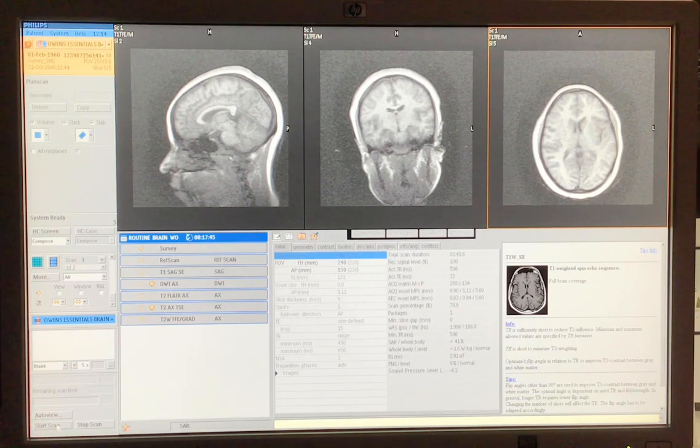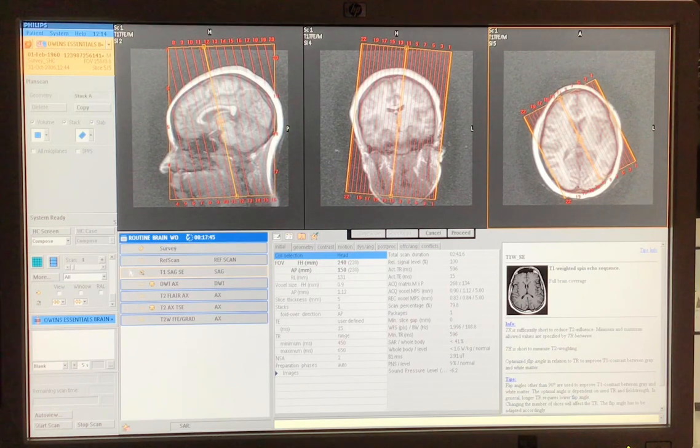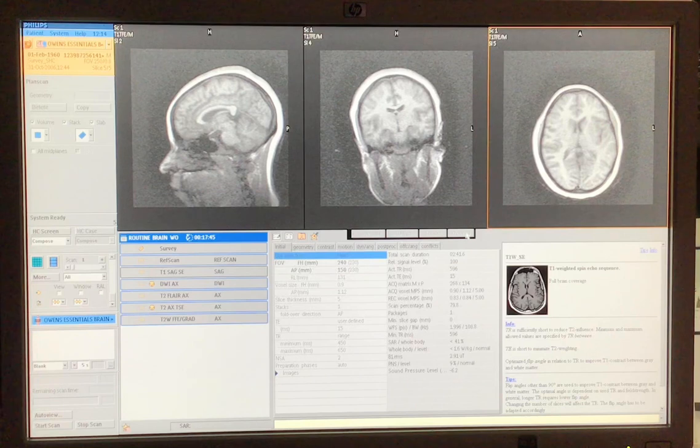and say, okay, let's pull this back up. Is that really how you wanted to scan this? Does that make sense? That would be an automatic failure. Any questions on that? No. Okay, good. So that's how you set up number 1 for a T1 sagittal.